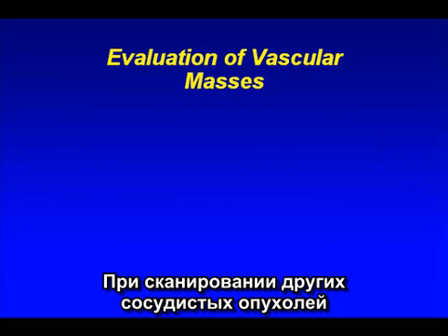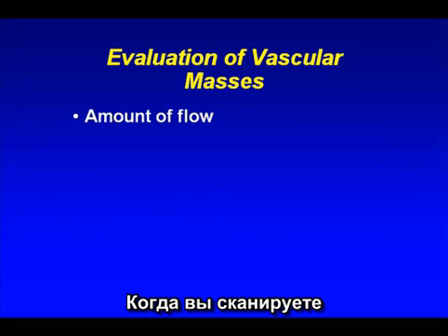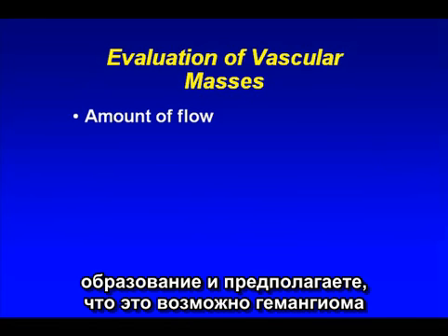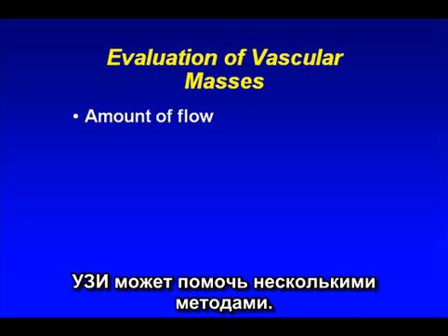Now, there are a number of vascular masses that ultrasound can really contribute to their evaluation. And when you're looking at a mass that you may think may be a hemangioma or some other type of vascular mass, there are several things that ultrasound can help you with.